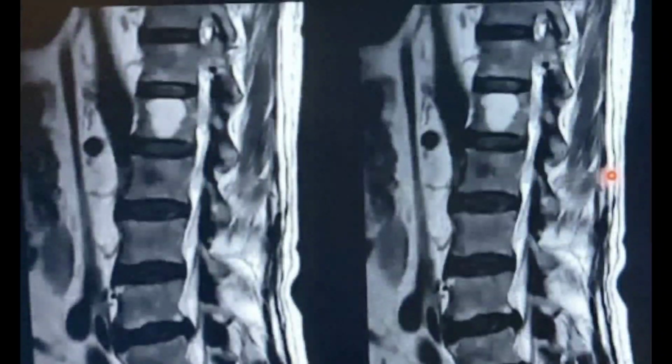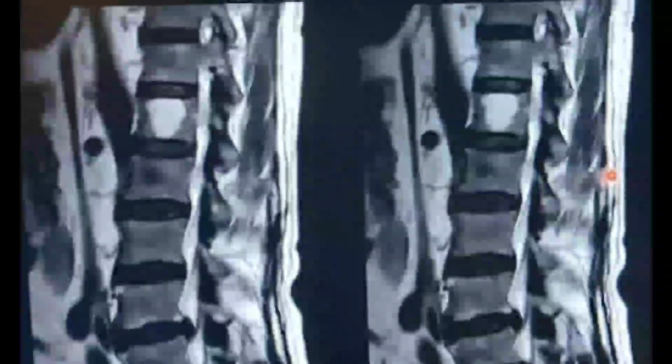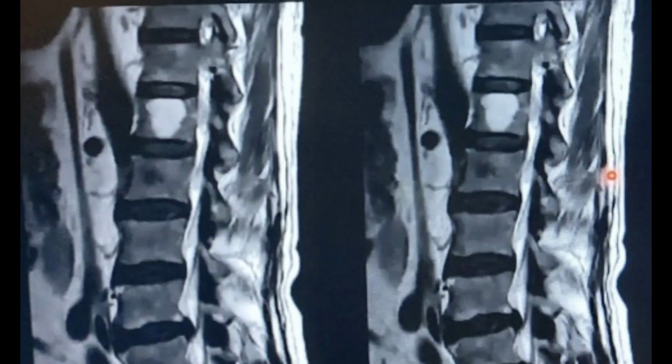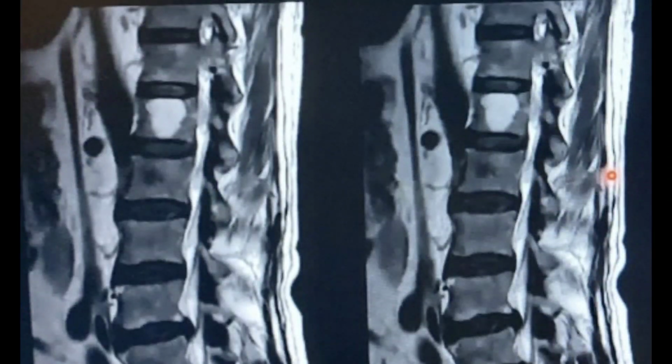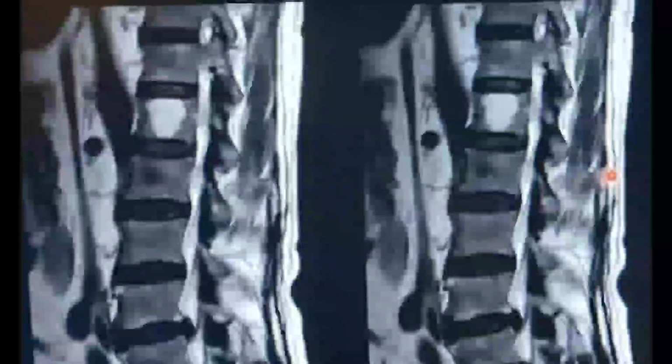Here is another characteristic feature, and on the MR you can appreciate the lesion on the MRI scan. MRI is the best modality, and predominantly enhancement of the vessels can be seen. Sometimes if there is hemorrhage, the hemorrhage may produce a fluid level. So in the differentials of a fluid level on the MRI, you can include the hemangioma besides some others like giant cell tumor and aneurysmal bone cyst. You can include the hemangioma. It will appear as a fluid level on the MR image.